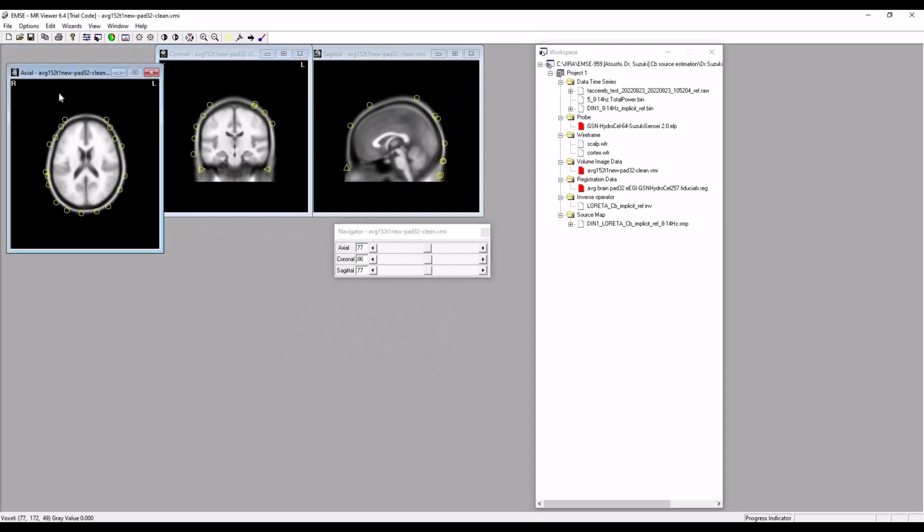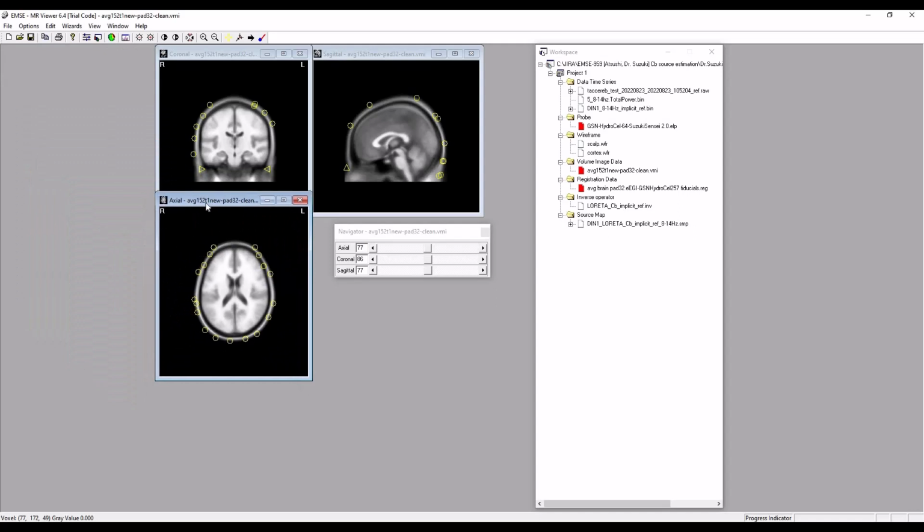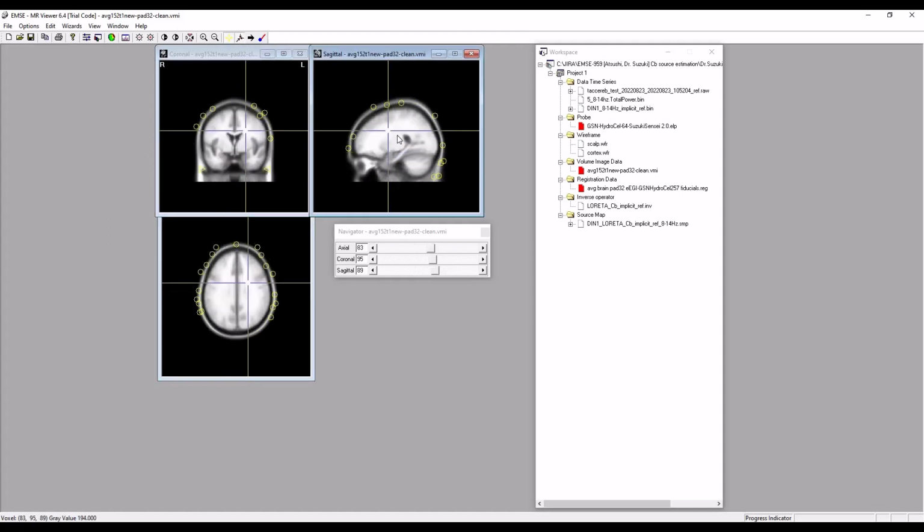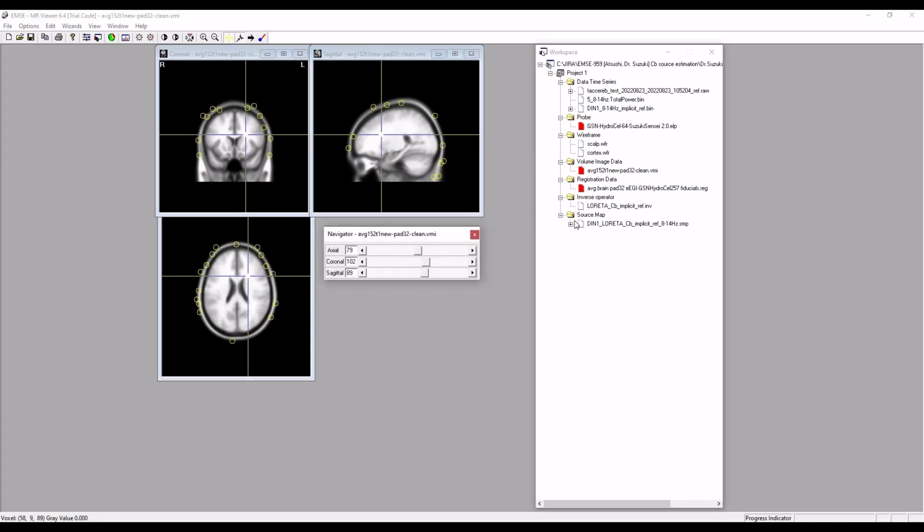But as an aside, I'm just rearranging this a little bit. Now I want to go to this mode here, warp to point. Now we can move around. Now here's cerebellum here. Okay, so now what I want to do is load this map data. So let's do this. Okay, now what it's showing us here first is the map. It'll be the average across the whole time period. But what we want, and I'll show you here, this one.